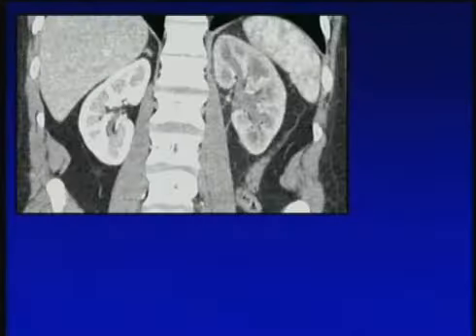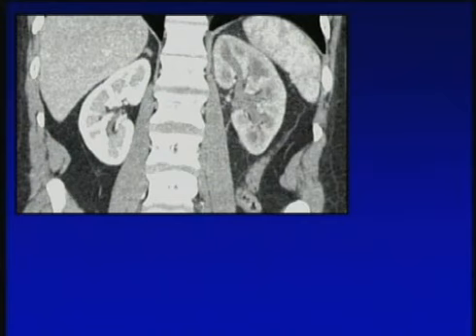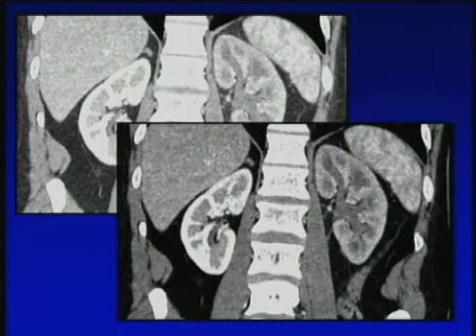And when you take those axial images and you put them in a coronal display, it's even more obvious. So one of the important things to recognize, a lot of the things that relate to perfusion of the kidney, a lot of things that relate to cortical medullary interface are really best defined outside the axial plane. So in all our dedicated kidney studies, we always provide the information beyond the axial plane, coronals, MPR, 3D, whatever we do, and we'll look at many of those applications, but it's critical to recognize that many of the visualizations are best seen outside that plane.